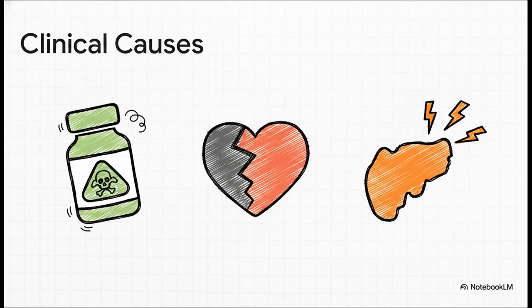So why is this diagnosis so important? Well, because an accelerated junctional rhythm immediately points to one of three very specific clinical situations: digitalis toxicity, myocardial ischemia, or a state of excess circulating catecholamines, like a surge of adrenaline. And this particular patient was recovering from aortic root surgery, which is a massive physiological stressor. This points us directly to that third cause. Seeing this on a monitor should trigger an urgent clinical workup for these three possibilities.